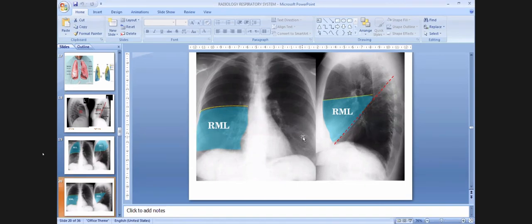Doctor, last question about the diaphragm. For example, can you give us a question about how it's coming? I will make an arrow in this area: the diaphragm, this one or this one, right or left hemidiaphragm. This is the diaphragm. Is it clear? Yes.